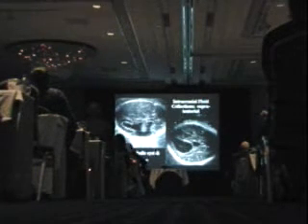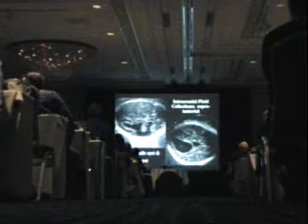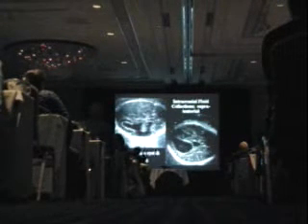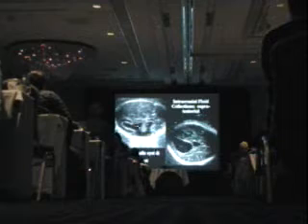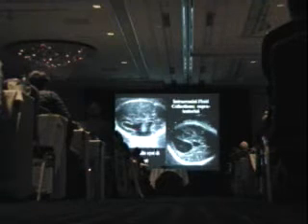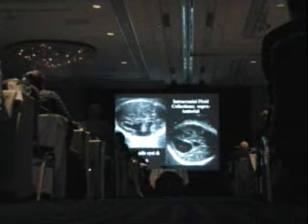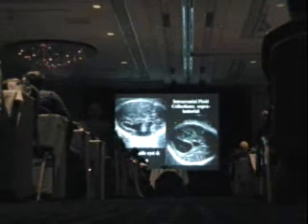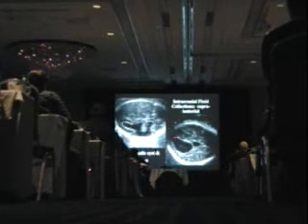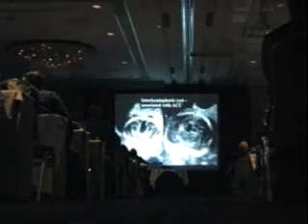Intracranial fluid collections can be of different types. The two main ones that I want to bring to your attention: porencephaly, which is basically a brain-destructive type of abnormality where a cyst develops that communicates with the lateral ventricles, and in this case, the lateral ventricle is dilated, the choroid is hanging down, never reaches the lateral wall because that's missing because of a large porencephalic cyst. Compare that to the arachnoid cyst, which may cause some ventriculomegaly because of pressure, but it is not connecting with the lateral ventricles at all.